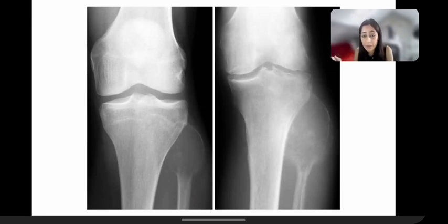Whereas on the right, once again, you can appreciate just by looking at the arthritic change in the knee that this is an older individual, and there was a similar expansile lucent lesion, which was a metastasis from renal cell cancer. For the lesion on the right, you would not consider giant cell tumor at the top of your list because we know it doesn't happen in an age group of more than 60 or 70.